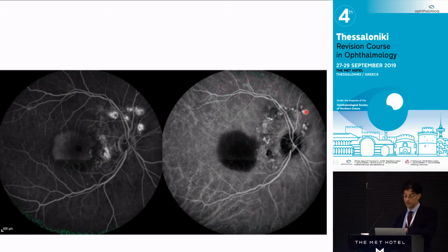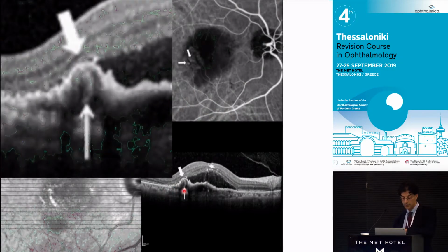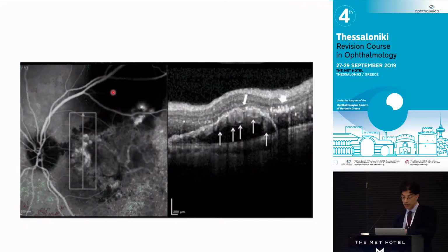Hemorrhage is not... nodules here with a branching vascular network. And on OCT, remember what I said about Don Gass and the herniating vessel here? If you zoom in, this is what we assume is the larger choroidal knuckle going through Bruch's membrane and herniating above, remarkably similar to what Don Gass drew. And there can be multiple of those.